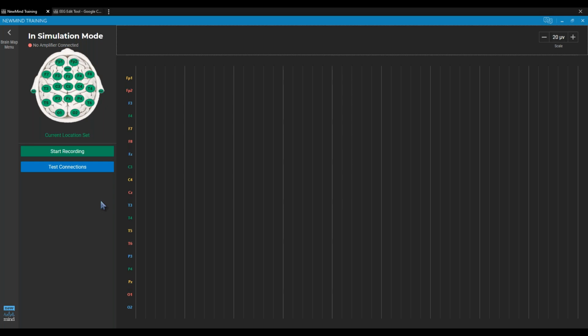So, I think part of your question, Andrea, was shutting off the auto artifact just to get it to go. Is that correct? I'm trying to read through this. Yeah, I saw changes. The map was stopping, and it was stopping for too long.